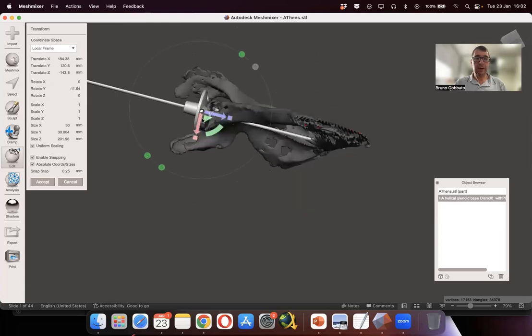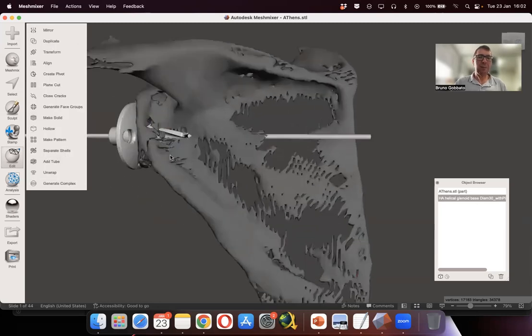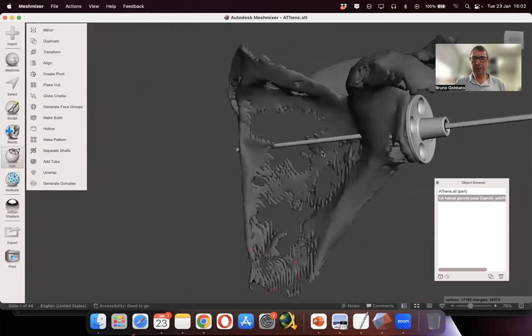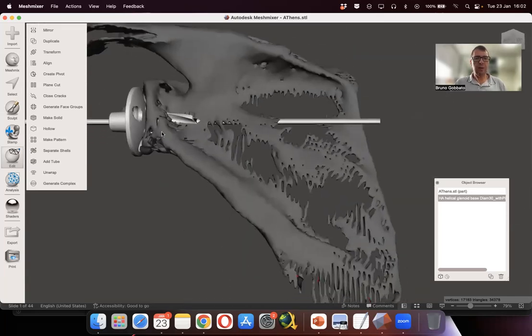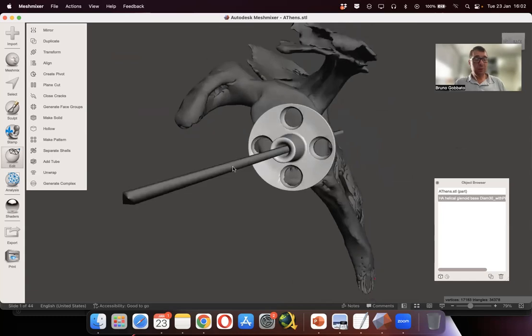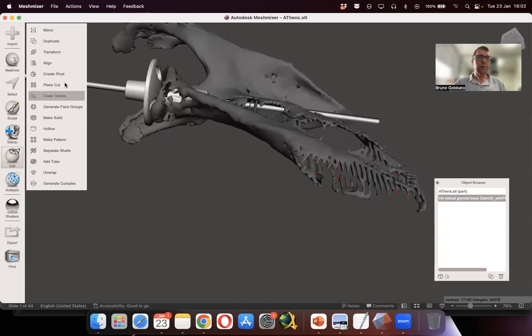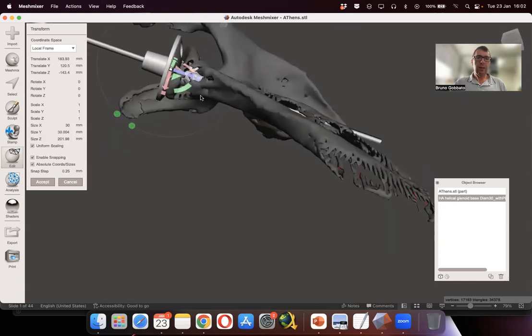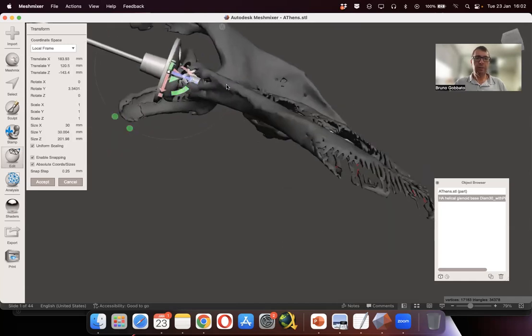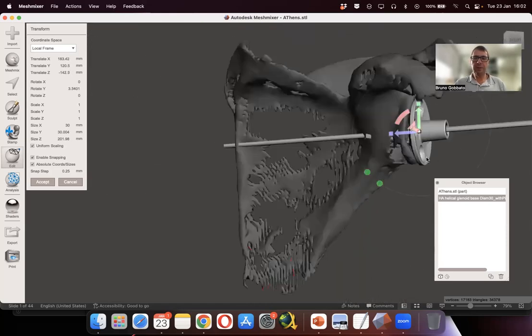As you can see, this is a very small patient, so we have to be careful with an implant like that. So that's the power of planning. This is an implant that I would not choose for this patient because it will perforate the vault of the glenoid. So it will be very hard to put this implant in a good position. We can go a little bit more for retroversion, transform. Let's do a little bit more retroversion of the implant, but still we don't have a very good fitting.